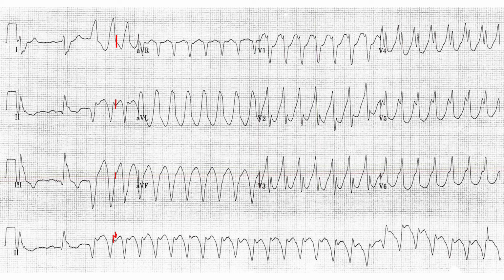a candidate P wave. But certainly, looking at the QRS morphology here, it's very slurred. Look at this slur here. This looks nothing like a bundle branch block. Bundle branch blocks often start off very fast and very sharp, activating due to the functioning bundle. So there's no way this is any sort of bundle branch block. This is almost certainly VT.